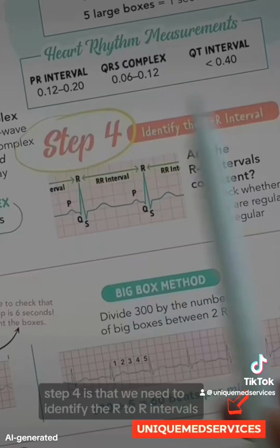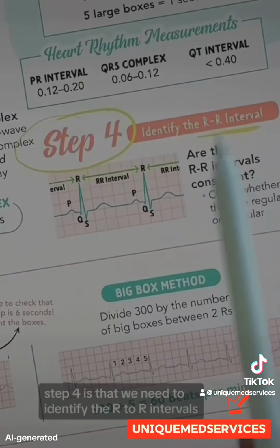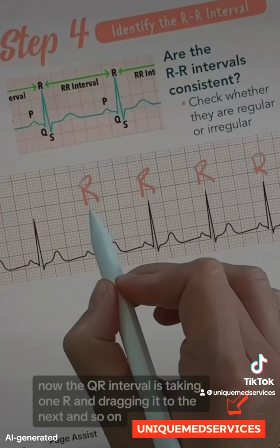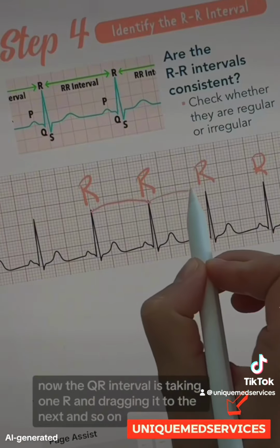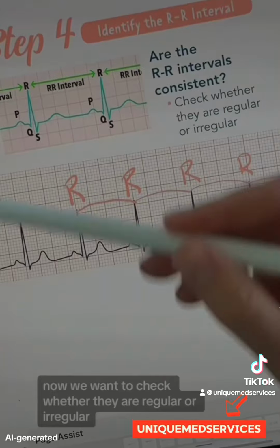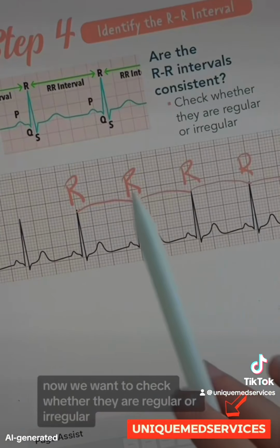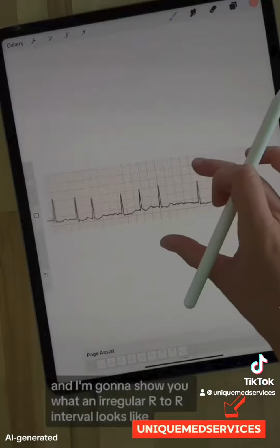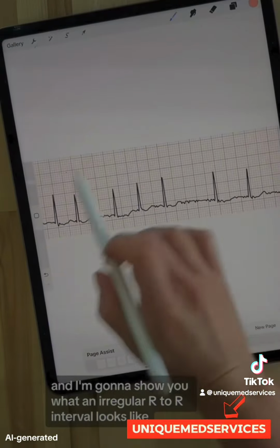Step 4 is that we need to identify the R to R intervals. First, let's identify where the R's are. Now the R to R interval is taking one R and dragging it to the next, and so on. Now we want to check whether they are regular or irregular. This looks very regular, and I'm going to show you what an irregular R to R interval looks like.